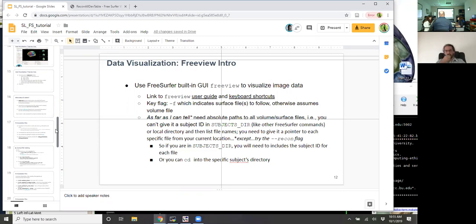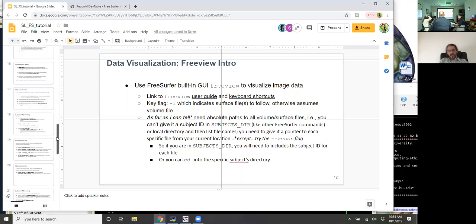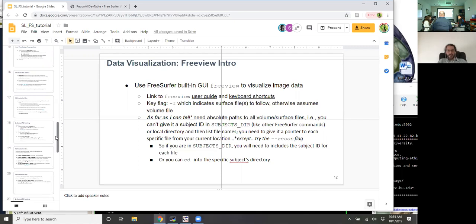So that our most recent color table that we're using today, you could load up a labeled volume from 5 years ago, 8 years ago, and it would still assign the appropriate labels correctly. But it would be really handy to have that. Otherwise, you're always having to put in a pointer to another file.